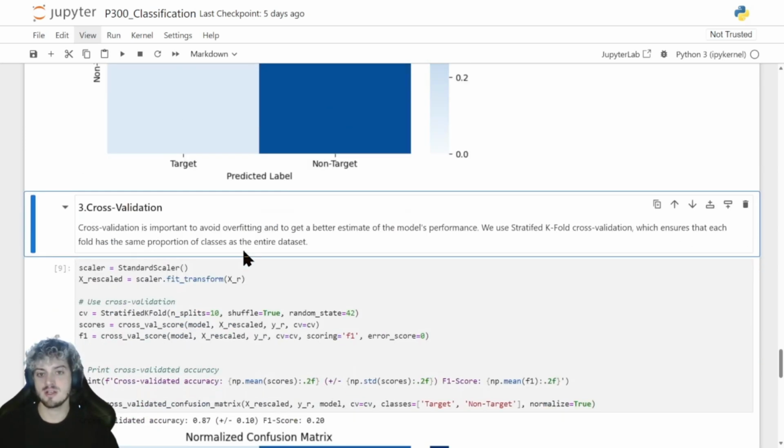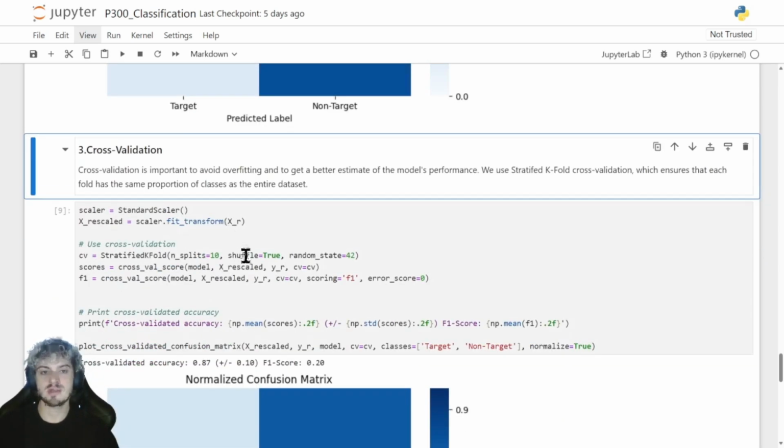That's called cross-validation. Cross-validation means that we iteratively split the dataset so that a piece becomes the test set, and each split is sequentially used as the test set while all the others are used as the training set. Basically, you validate over each split of the dataset whether your classifier is good or not.